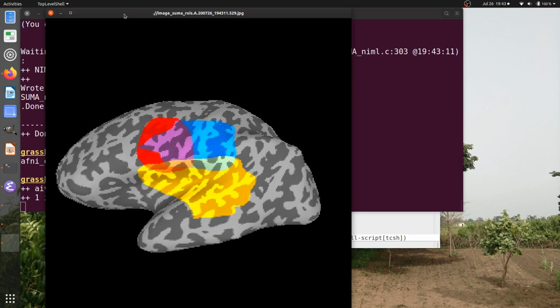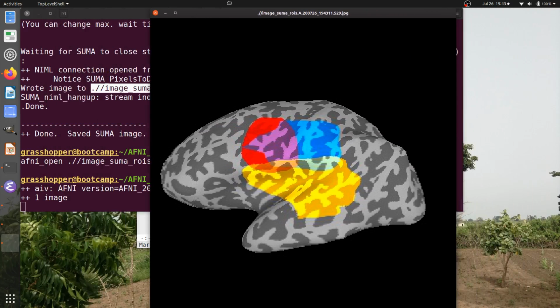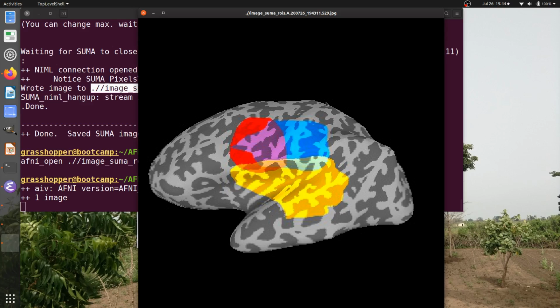So we may have fondness for earliest Mario video games, but that may not be what we'd want in our image. If we were really doing this, we may actually want a larger view panel. If you want essentially a higher resolution image, what you do is you open up SUMA bigger, and then when you finally display it at the real size, it has smoother contours and less pixelation like this. Okay, but anyways, proof of concept.